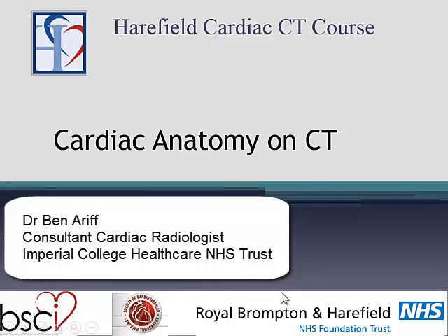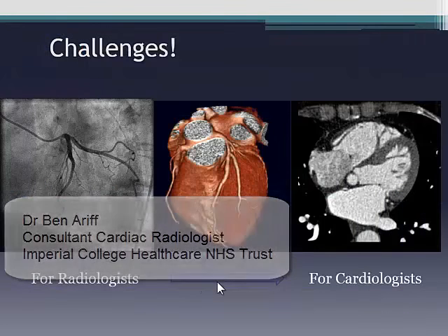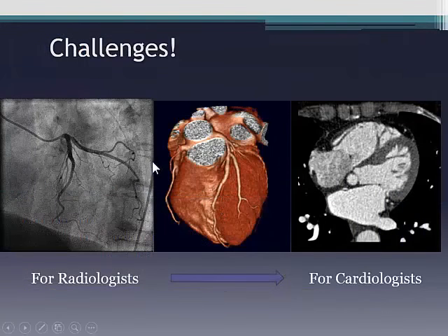Okay, so what we're going to do is just go through what you've gone through already. Obviously from the radiology challenge, it's really about orientating yourselves with regards to the coronary anatomy, but also the cardiac chambers, because traditionally we close our eyes to looking at the heart. And from the cardiology point of view, what you're going to have to get used to is looking at images in a totally different way. In other words, in the orthogonal planes and in the multiplanar format.